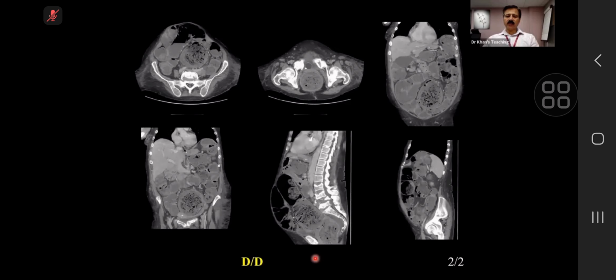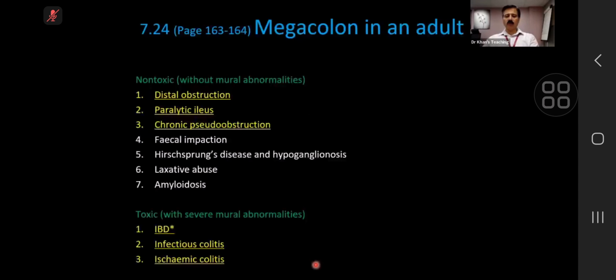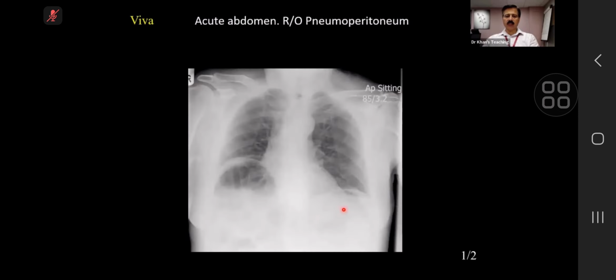Having said that, sometimes these patients can also perforate, and I've seen a few, so don't think that it's a completely benign condition. There will be a time when they will perforate. But the concept of pseudo-obstruction should be in your mind. And this thing, chronic pseudo-obstruction, in the UK, is a very important concept, particularly in A&E. Okay, candidate 1, this is your last film.